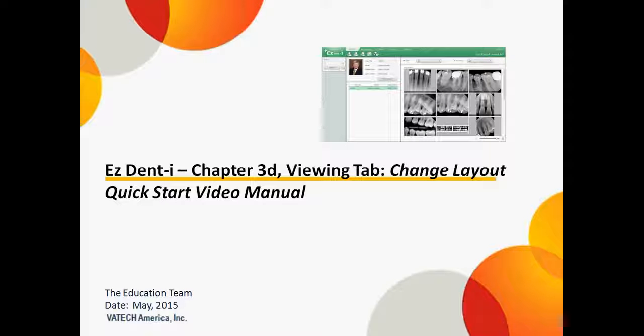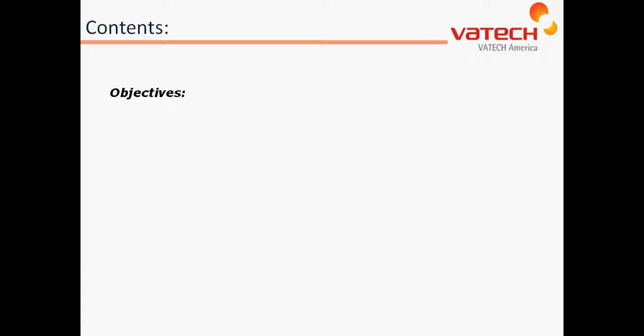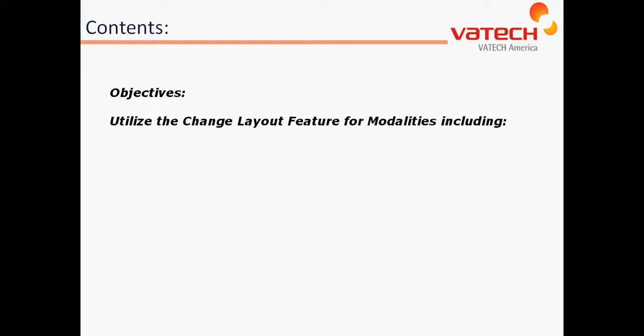The Vatech EzDent-i Quick Start Video Manual, Chapter 3D, the Viewing tab, Changing Layouts. In this presentation, the objectives will be to utilize the Change Layout feature for modalities including panorama, cephalometric, intraoral sensor, as well as intraoral camera.